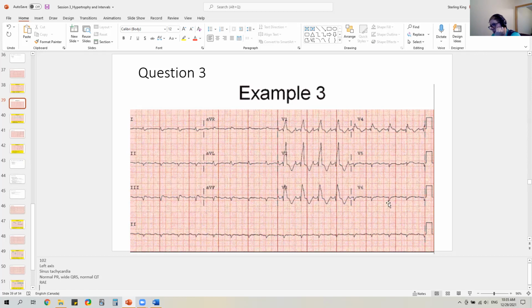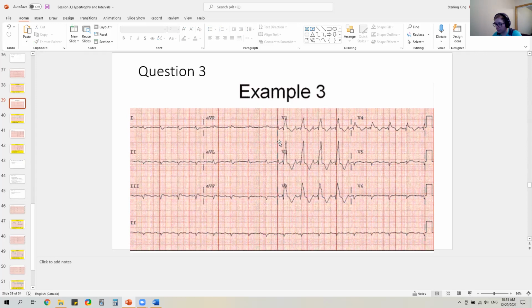And yeah, there's definitely no ventricular hypertrophy from the left ventricle. From the right ventricle, though, this looks promising because we see a nice big R wave over here and a predominantly S wave in V6. So query right ventricular hypertrophy. It probably is. However, this wide QRS might be throwing that off because we see this RSR, and you know what that is? That's bunny ears. So bunny ears means a right bundle branch block if it's in V1.